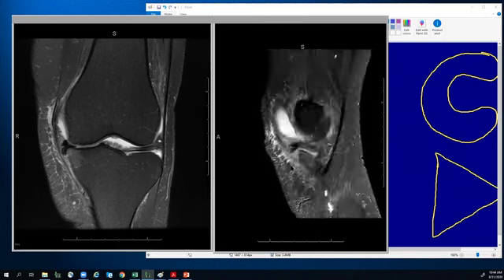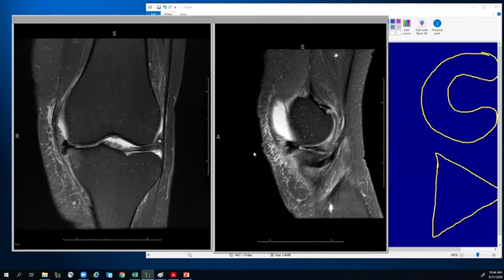This tear pattern is something to be familiar with. The reason it's important to note this tear pattern is because when the surgeons go in, they're going to go in centrally and find a meniscus tear, but they won't necessarily know that this flap exists. They need to maneuver their scope around the meniscus to get a good look at this flap. If they know in advance that they need to do that, that will help them find this portion. And then basically they have to cleave this off because you can't leave a flap like this located here. It causes the patient a lot of pain.